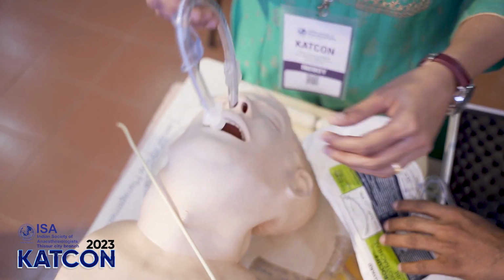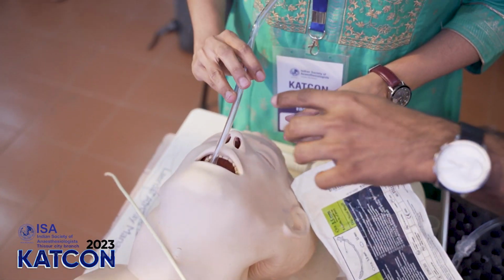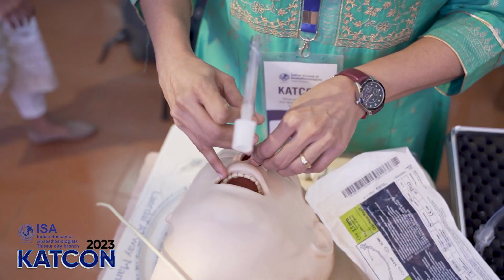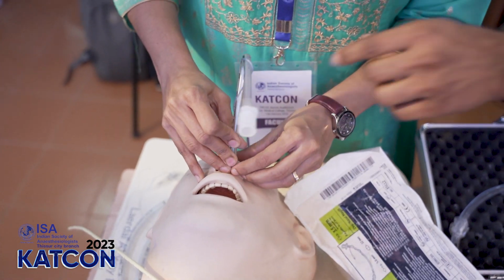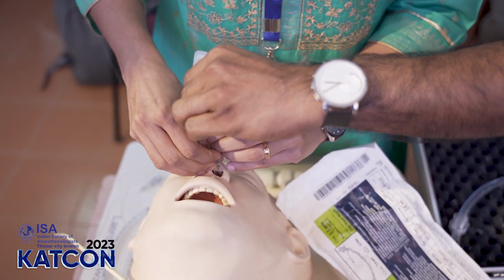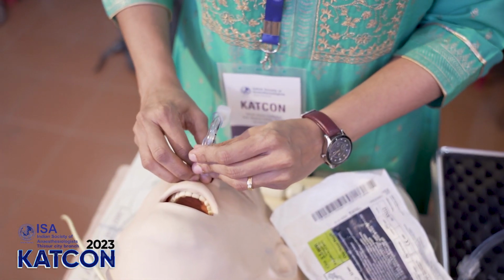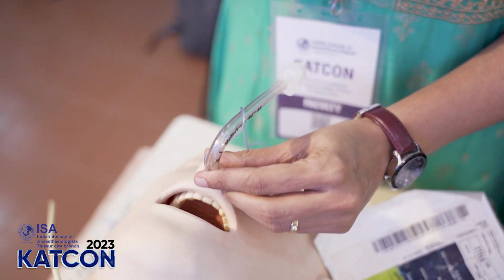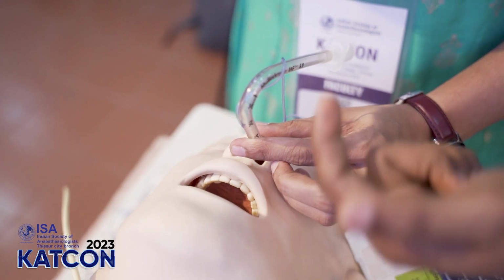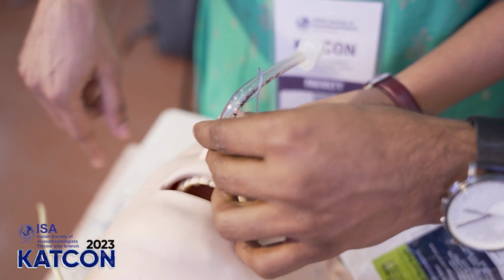And this is called a RAE tube, Ring Adair Elwyn tube, RAE tube, south pole. The other one is north pole. This is usually inserted nasally, and it remains in this position. You have to use a laryngoscope anyway. It remains in this position so that the tube is directed upward or northward. So these are the 2 different tubes.